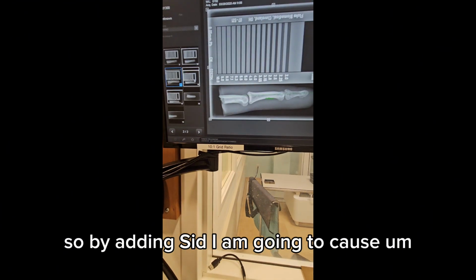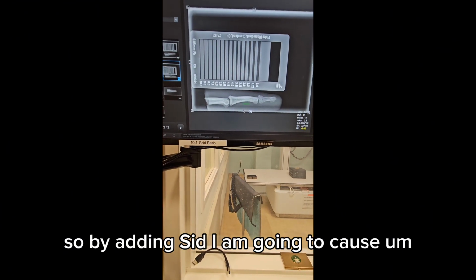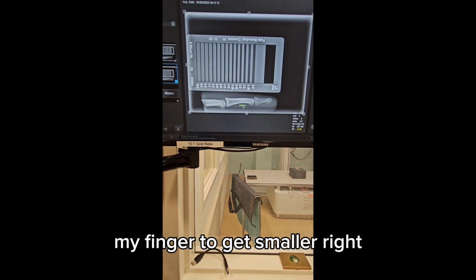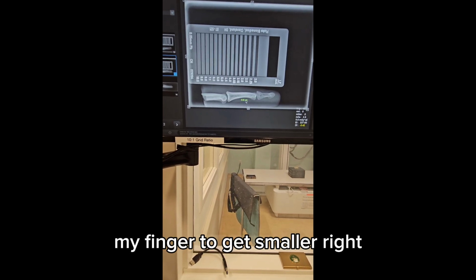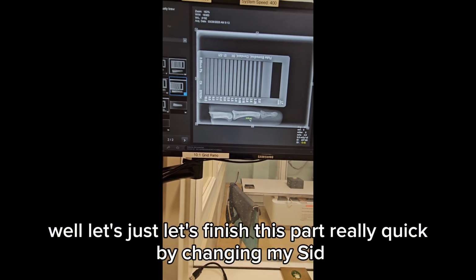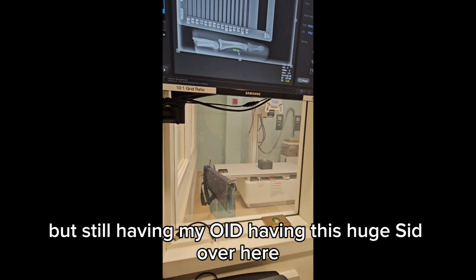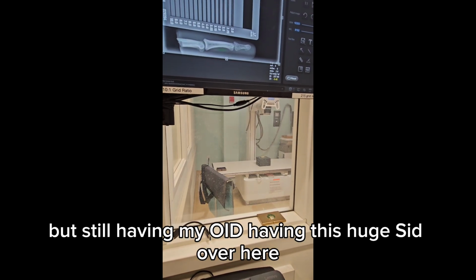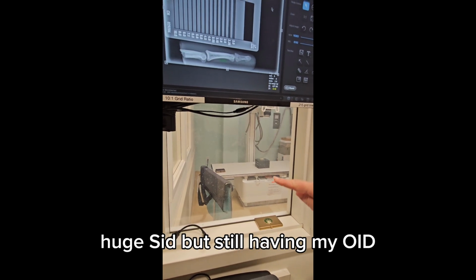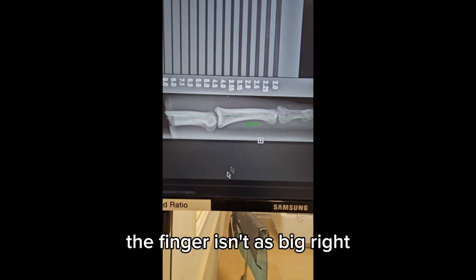So by adding SID, I am going to cause my finger to get smaller, right? In addition, well, let's finish this part really quick. By changing my SID, but still having my OID, the finger isn't as big, right?